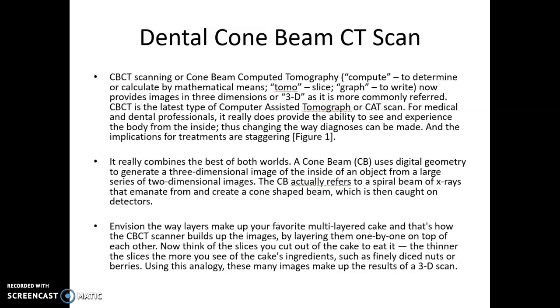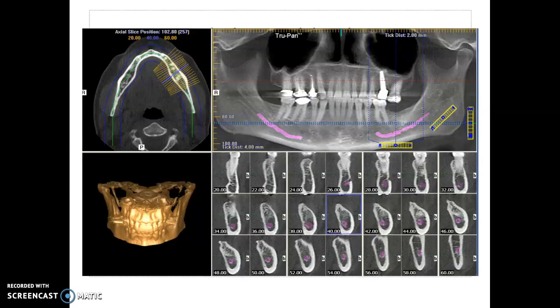I'm going to spend probably the rest of the video explaining how to read them. That's not something you're necessarily going to be expected to do, but if you get into an office that uses a lot of CT scan or CBCT technology, I want you to be familiar enough with it that you know what you're looking at. That way you're a little more comfortable looking at the images as the dentist or doctor is talking about them.